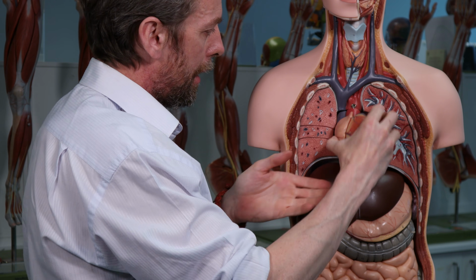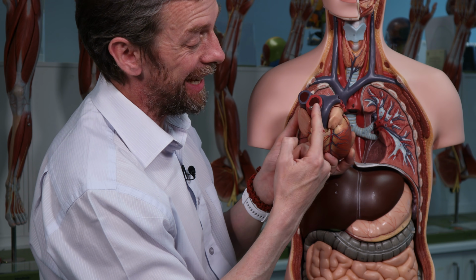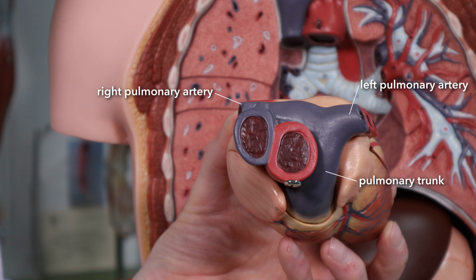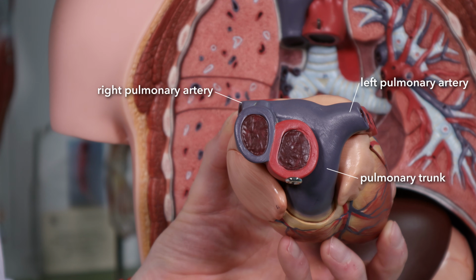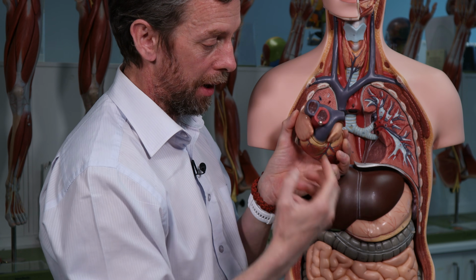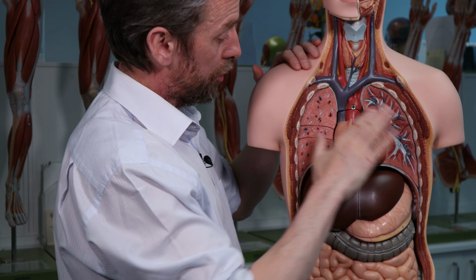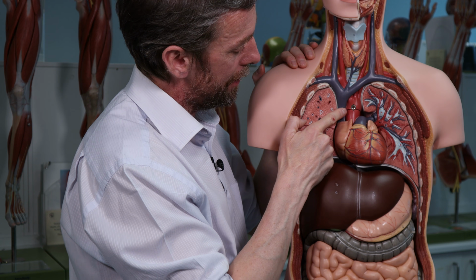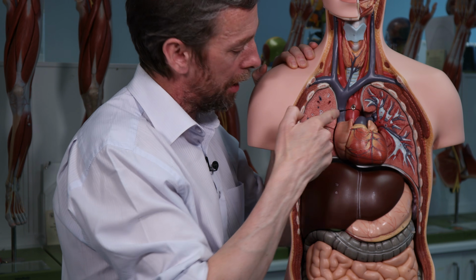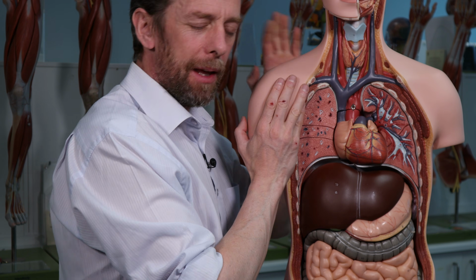And then the pulmonary trunk, so if that's the aorta, the pulmonary trunk is to the left of it, but look at that shape. The pulmonary trunk doesn't go up, it goes up a little bit, it goes posteriorly. So it makes that curve, and then we have left and right pulmonary arteries. So that's the shape we need to look for in transverse section. There's the superior vena cava, the aorta, and then the pulmonary trunk. But the pulmonary trunk is inferior, it's certainly at a lower level, to the aortic arch.